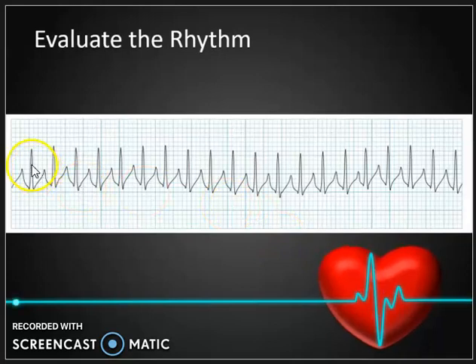All right, we're going to look here. Let's look at our QRSs. QRS, all normal. Okay, going across. Regular rhythm, rate tachycardic, P waves can't really see them, can't really measure PR intervals. QRS tiny, normal. T waves, can't really tell them, no ectopic beats. Supraventricular tachycardia, SVT.